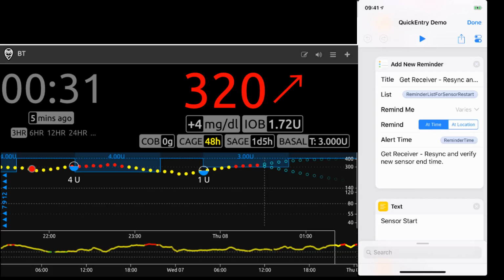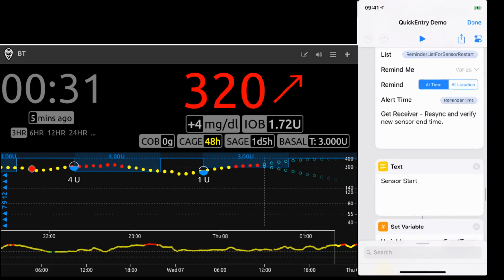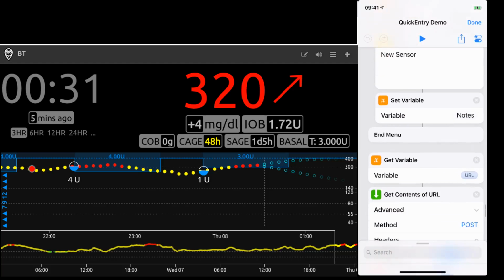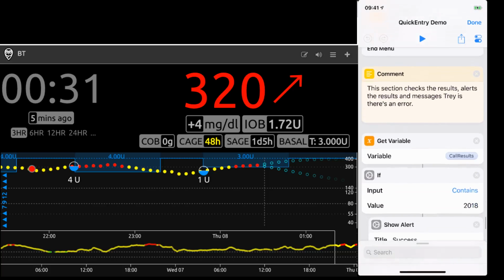At what time? What list do you want to put it on? What verbiage do you want to have it say? So that's pretty handy. And you can do all kinds of things. I'll show you some of the stuff you can do. And then we make the call. And then this is the end of the program.